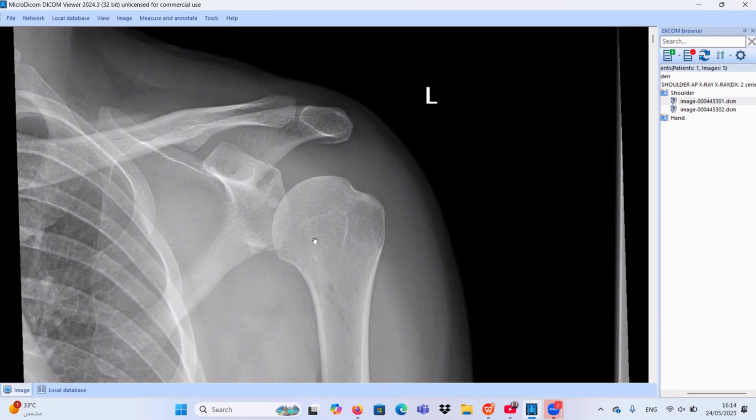If we have anterior shoulder dislocation, it will be located under the coracoid process, subcoracoid. If it goes further, it can be under the clavicle, subclavicular, or even intrathoracic. So at this point we don't have any evidence. Downward displacement, I mean downward anterior. The projection is misleading.